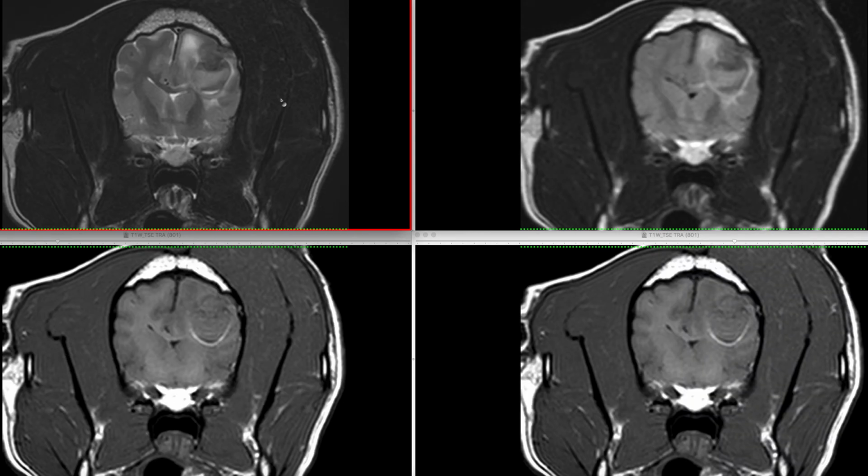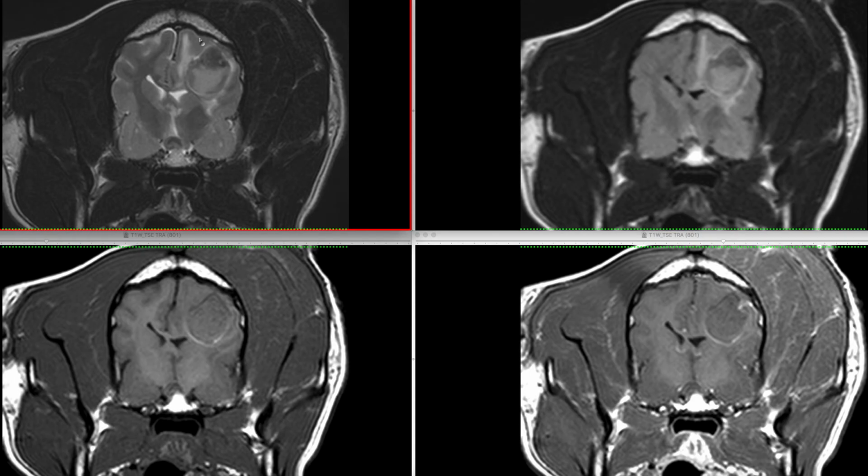One of the key things we need to think about is whether we think these are intraaxial lesions or extraaxial. These are clearly intraaxial. They are kind of globular in shape, centered within the white matter, and we can see the defining feature of an intraaxial location, that we have cortical grey matter interposed between the largest mass lesion here and the calvarium. So, multiple nodules and masses, intraaxial.